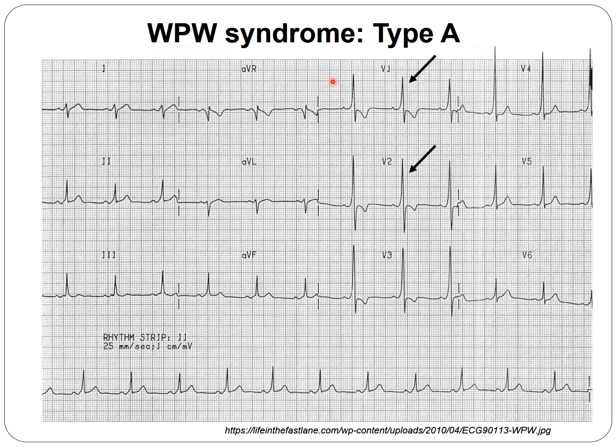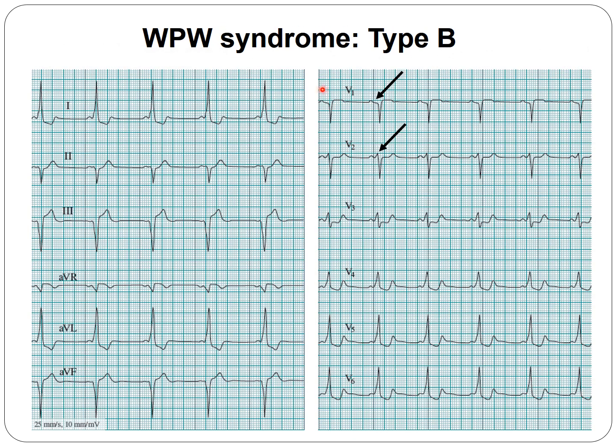As you see here in these tracings, the PR interval is short, which can be seen very nicely in lead 2, lead 3, and especially in the chest leads, in V3, or as you are looking here all the way down, that's lead 2. And if you look at V1, you see this delta wave is starting upward. So this is a type A WPW. Opposite, when in V1 we have a negative deflection of the QS complex, that's type B.